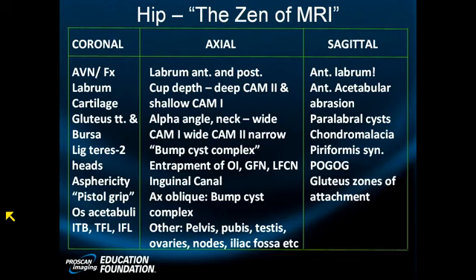Bone marrow. Unfortunately, the hip is a place where metastatic disease likes to go. Countless number of times, patients come in with hip pain, and there is an iliopectineal eminence breast carcinoma met. Look at the bone marrow as part of your search pattern.